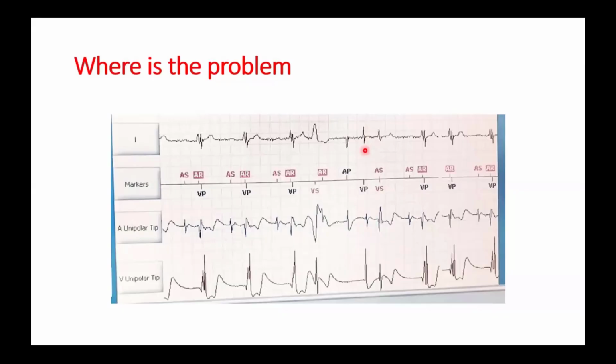So pacing firing a spike in the ventricle not followed by capture. So exactly.